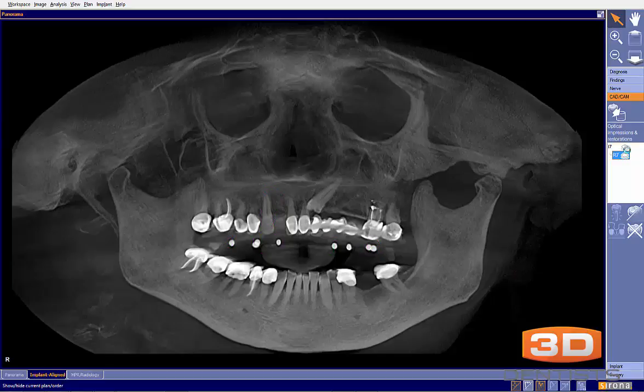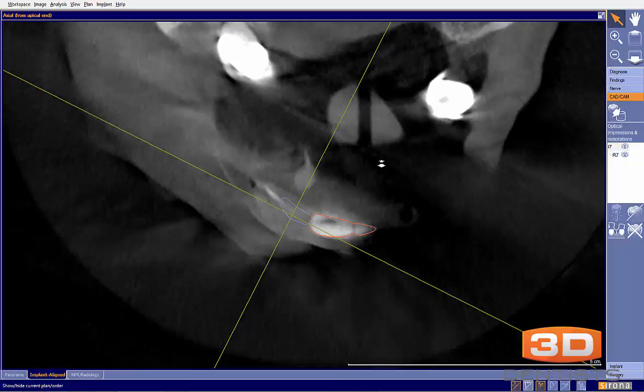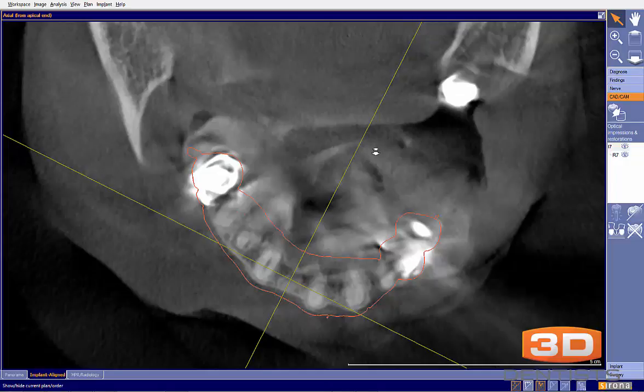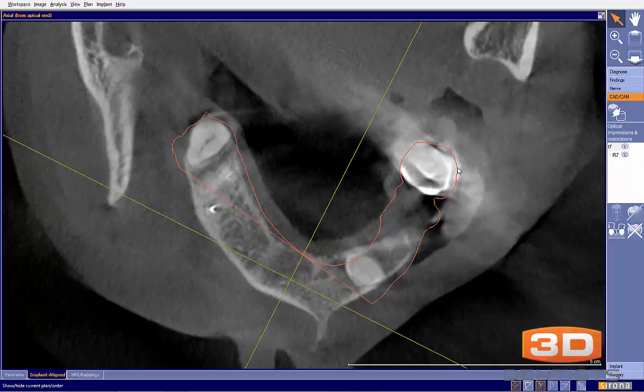In this particular case, it looks like the dentist was able to integrate in the CEREC data, but as you take a look at it here, what you'll get back from CCAT is that they cannot verify that that data is correct due to the amount of scatter. For example, right in here, is that the end of the crown, or is the CEREC data the end of the crown?